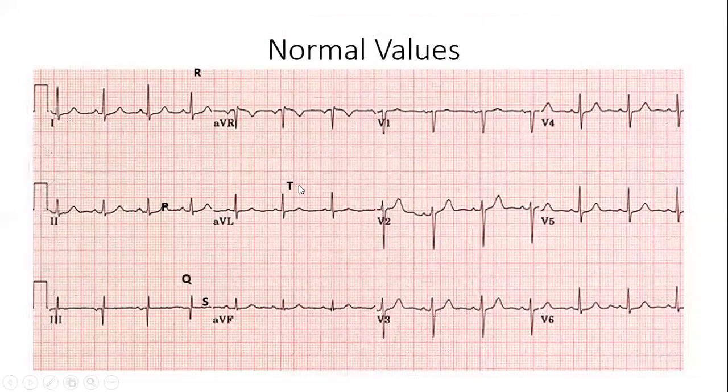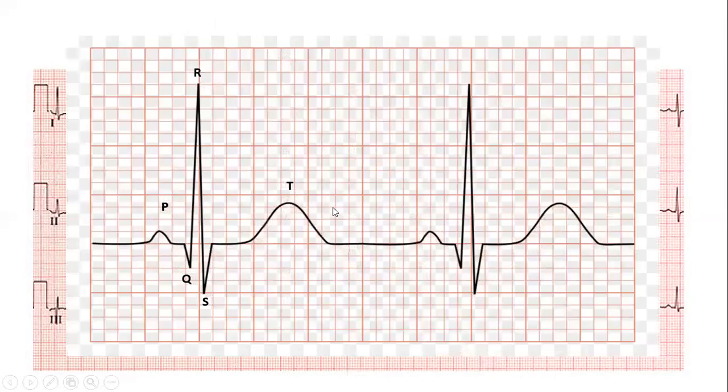Now, since we have determined how big each box is, we'll be able to determine the normal values for the different intervals, the different segments and so on.